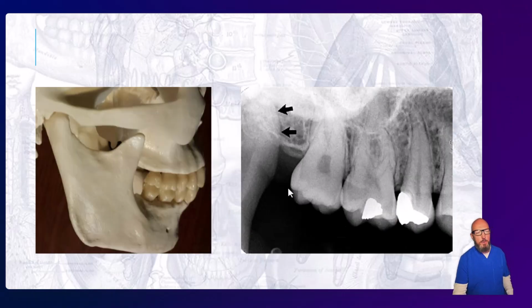And this is another rare structure to see. It's a mandibular structure, but it's showing up in a maxillary radiograph, and that's when the coronoid process overlaps your maxillary radiograph. So I've seen one example when a dentist thought this was a tooth root. He planned to go in and extract it. Luckily, he took another radiograph and confirmed that there was nothing there. He was just looking at the coronoid process of the mandible, so that can project in some cases.